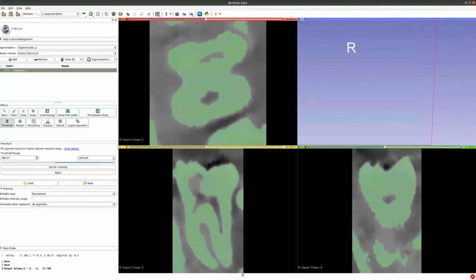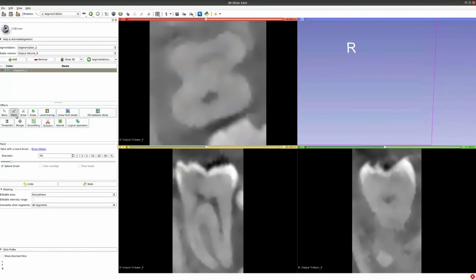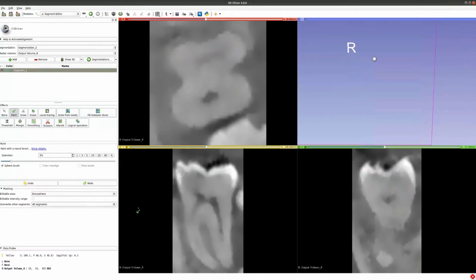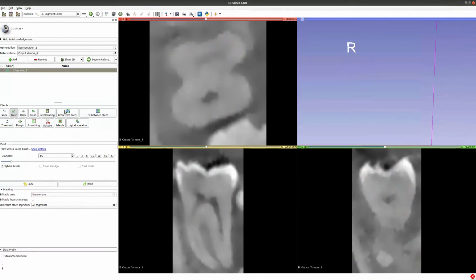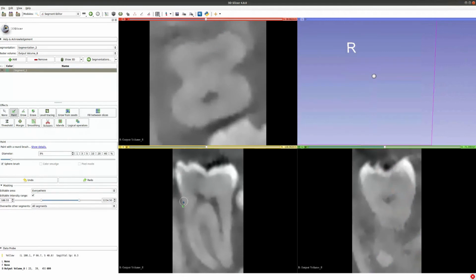It looks way more smooth, but we still have these neighboring teeth being highlighted also up here. So instead of this, we will manually paint some here on this tooth, and then be using this grow from seeds. So also here, remember to click the spherical brush, and we can also set a range. So if we just hover here, we can get an idea about that on the edge here. It's probably like 450 or something.